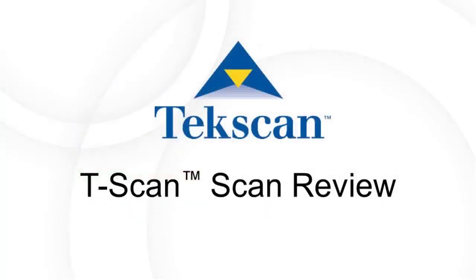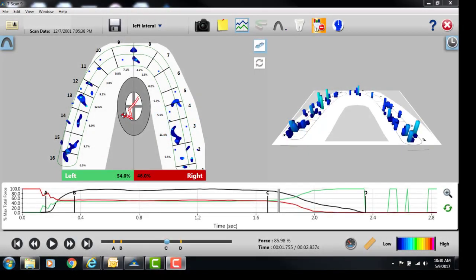Welcome. In this demonstration, I just wanted to review a lateral excursion and the steps on understanding how and where to adjust if we see a scan. So with this case, we have a patient that seems to have a decent bite in regards to balance. You can see that the dark blue forces and some lighter blue are sprinkled throughout the arch. This displays that we have some even balance.